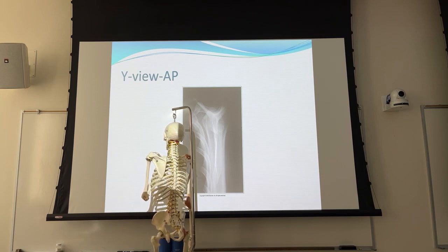So AP versus PA is your choice. Most people shoot them AP. I always like to shoot mine PA. I point some of these things out because if you're the outlier in the hospital, you really need to mark your images as such. If everybody else in the hospital is doing their Y views AP and you do yours PA, it might look like you mismarked your images compared to theirs. So you might want to make some sort of annotation on the image that you shot it PA versus AP, just to make sure that there's not any kind of confusion.